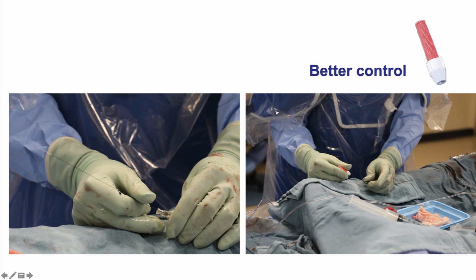For example, when trying to cross through collaterals, one may want to not use a torquer, especially septal collaterals in the surfing technique, so as to spin the wire between the fingers and also make bigger movements than would be allowed had a torquer been attached to the wire.